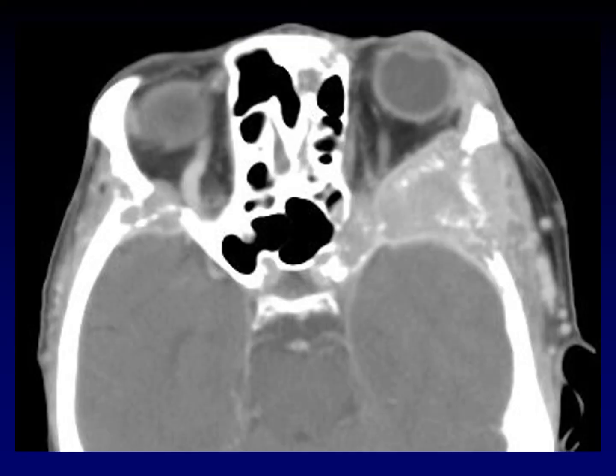Here's an example of a patient with metastatic disease to both sphenoid buttresses, and you can imagine where compression of the optic nerve is going to be a problem right here. This is not going to be a problem because all the fat will just get out of the way and you won't have a crushed nerve. This is where the problem is at the optic canal. This sort of mass can be surgically decompressed to permit the optic nerve some space, even without resecting the mass itself. You can decompress the opposing surface of the canal.